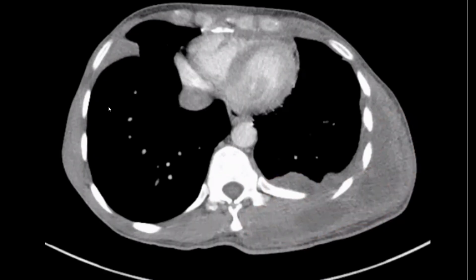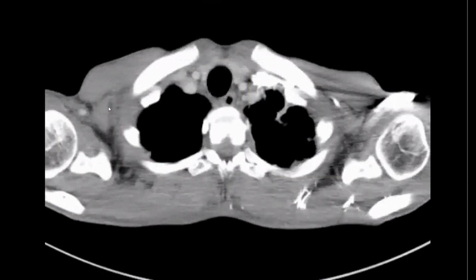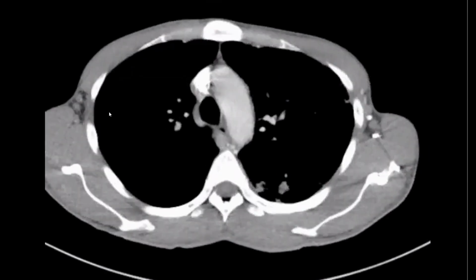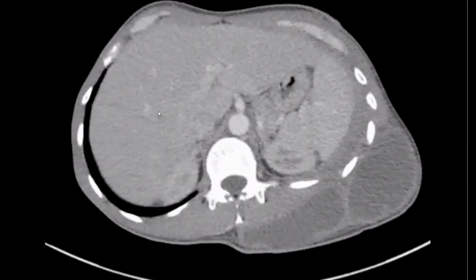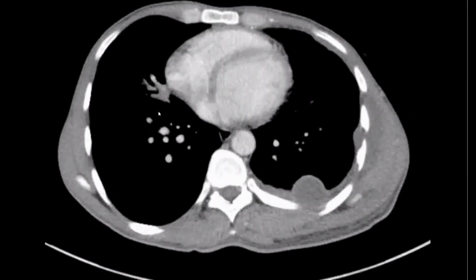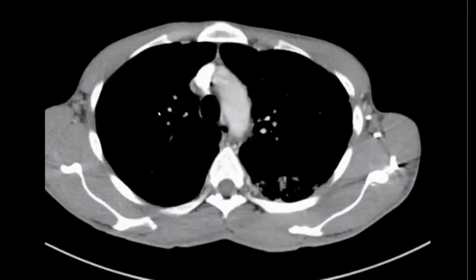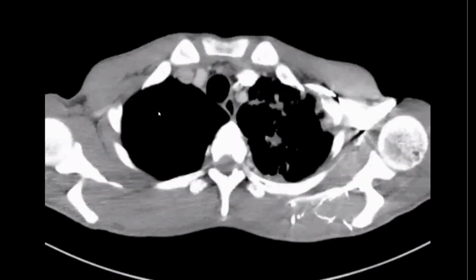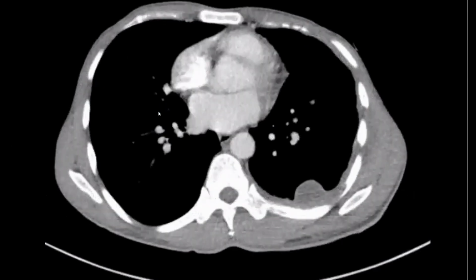Okay. Yes, so this one is called empyema necessitans, and I agree with you that this case needs to be correlated with the previous studies, correlated with the clinical data, needs sputum analysis, and searching for acid-fast bacillus, and also it should be discussed with infectious disease MDTs, because this one is one of the complications of tuberculosis infection. Okay, thank you so much.